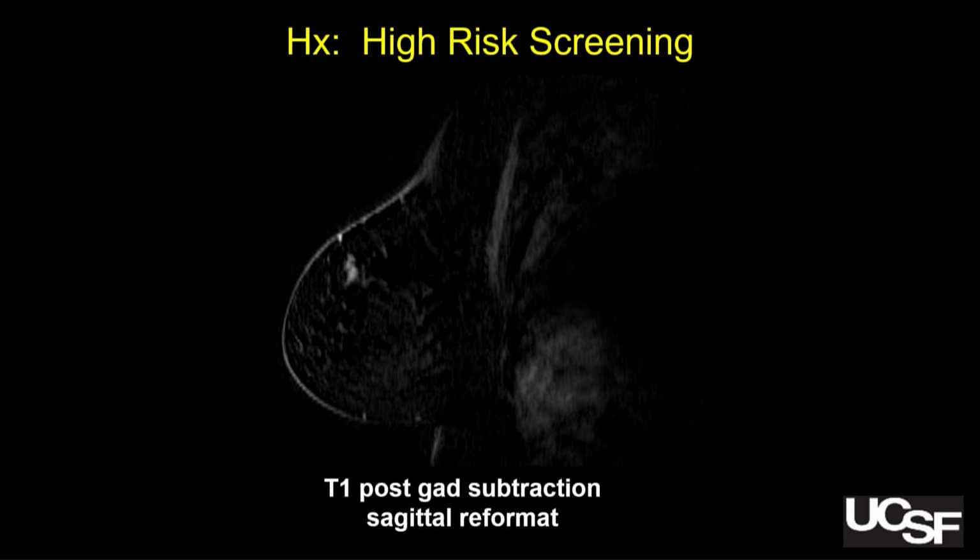Okay, case 3, high-risk screening. This is a subtraction. It's a sagittal reformat, and there is an obvious white spot there. Okay, so not an eye test.